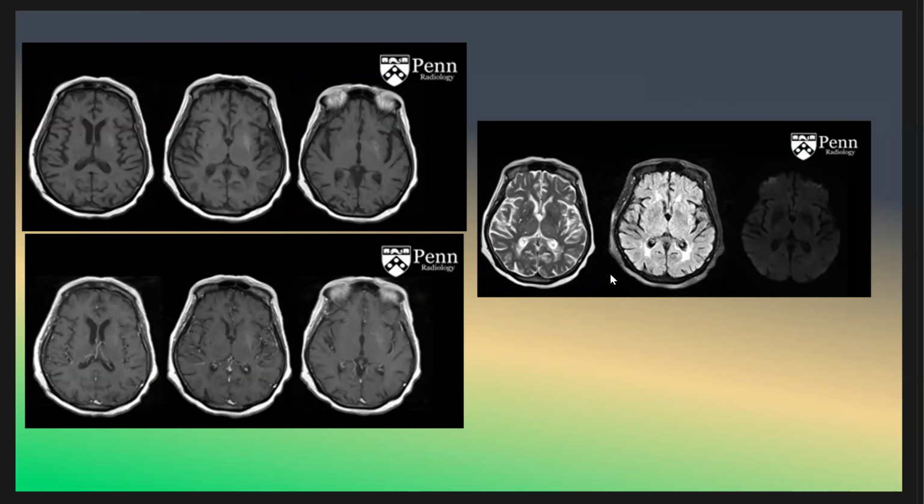This patient is an 80-year-old woman with involuntary movement in the right lower extremities. What do you think the patient has?